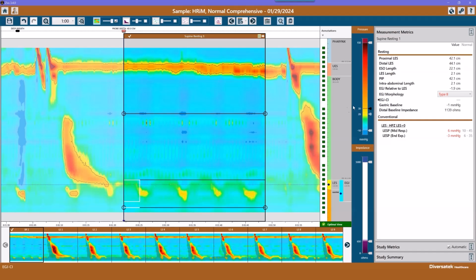It does not give a value in the metrics until the mark is adjusted. So if no value is desired, just leave the mark unadjusted. There is no normal value yet for this metric, but it can be acquired and then compared between studies in a particular facility.